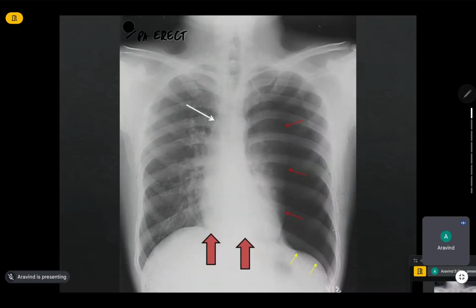Okay. These red arrow marks, just observe the red arrows. These tiny red arrows, and you tell what is happening. Coarctation of aorta. You just observe the lung field. Could you see the lung fields here in the left side? Means the lung field markings. No, so there are no lung field markings. It is very clear, but it is blackish. So black indicates what?